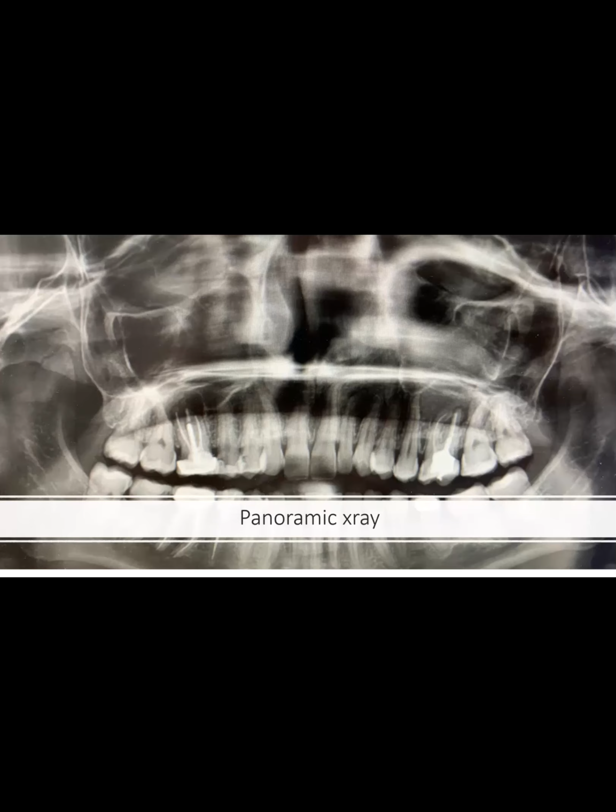What type of cyst would you call it? Radicular, because it's non-vital. Right, so a radicular cyst associated with previously root canaled teeth. Yes. It's 2 teeth, so what are the odds of being anything else, correct? Yes. Based on the information we have, I think radicular cyst is right.